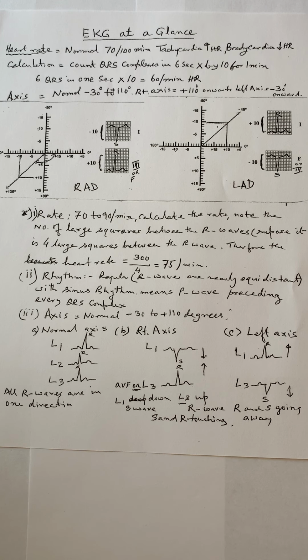Then you put another line that is S, on the minus side, on the left hand side towards 180. So you put minus 10 towards 180 and plus 10 towards the positive.